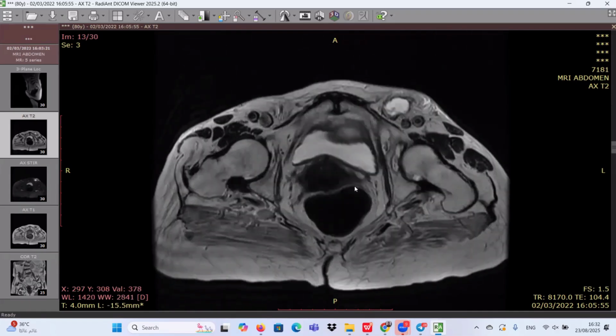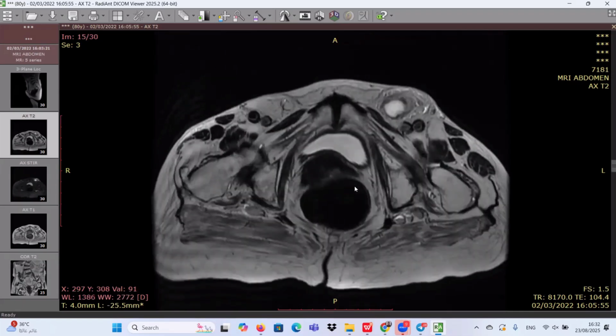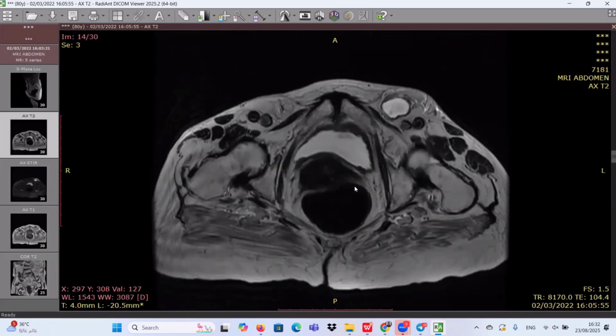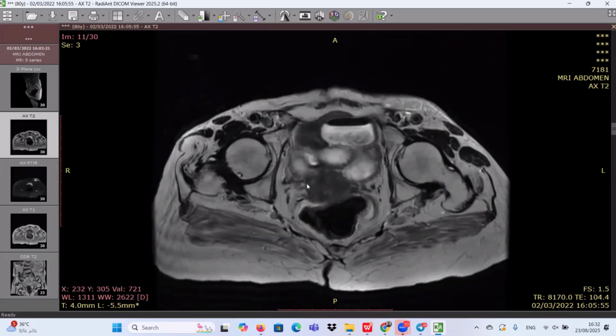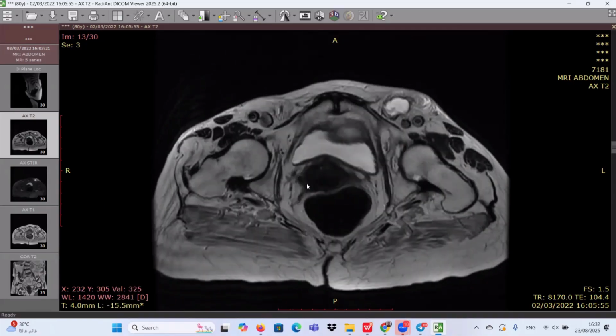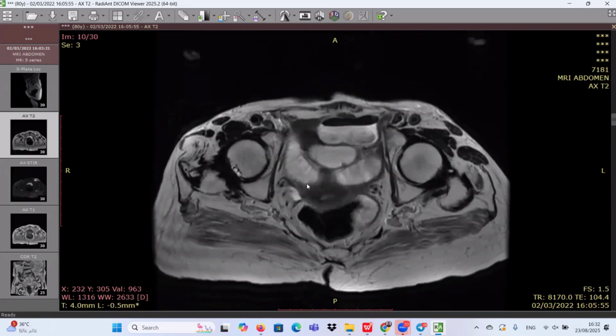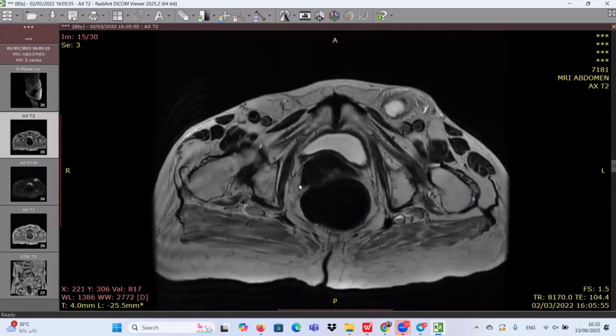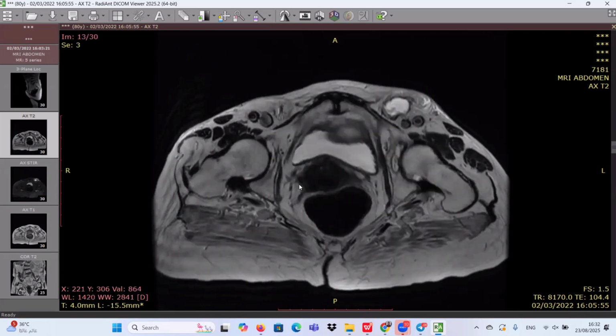Yes, I'm able to see the bowel in continuation. So small bowel. This hernia contains small bowel and omentum, and appears to be narrow at the orifice, a narrow neck, likely causing the dilated small bowels.